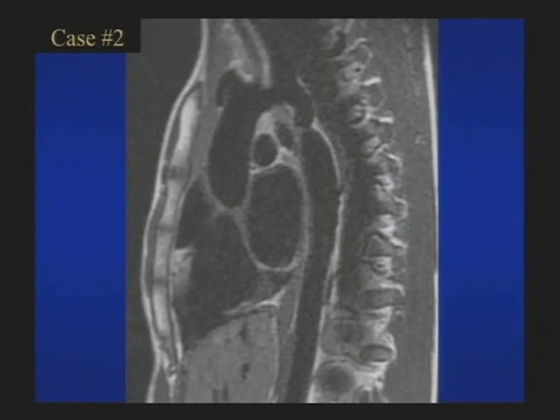What kind of image is this? This is a sagittal MR image, sort of oblique sagittal, and maybe a clue: that's a blood vessel, and what color is the blood? Black. So that may be a clue as to what kind of MR sequence it is. And then what's the abnormality? This is someone with hypertension. Very simple, black blood. I like that.